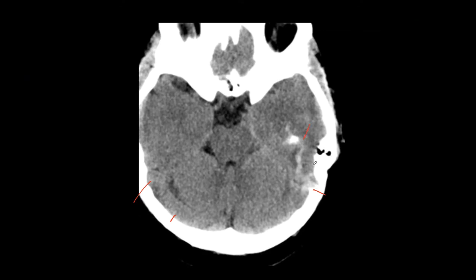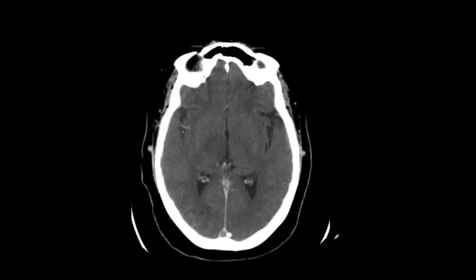I do see hyperdensity, which looks like hemorrhage, and there is edema in this region. So this would be a hemorrhagic lesion in the setting of a thrombus in a dural sinus. Definitely this is going to be a hemorrhagic venous infarct, right? So in one image, you can actually make the diagnosis. And that was a non-enhanced CT.